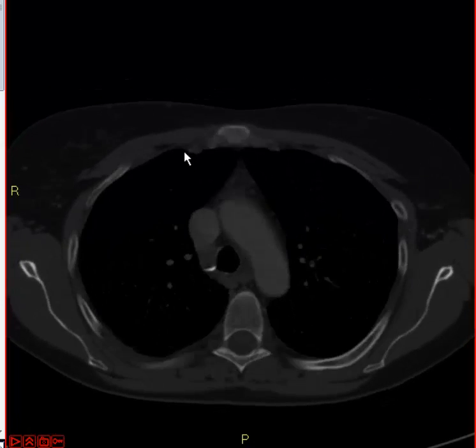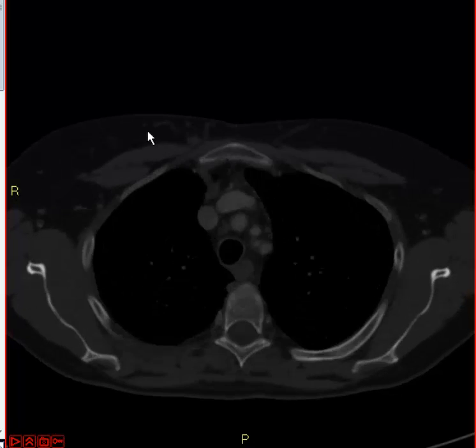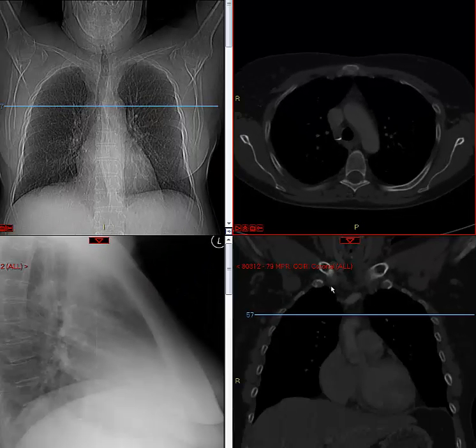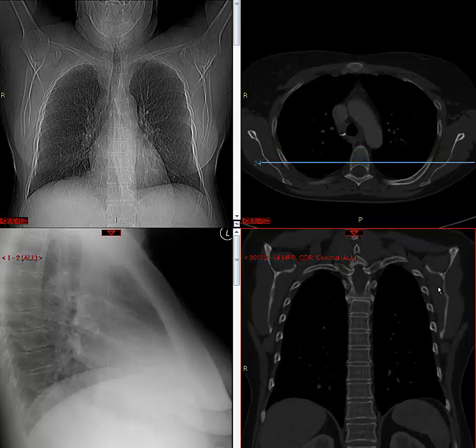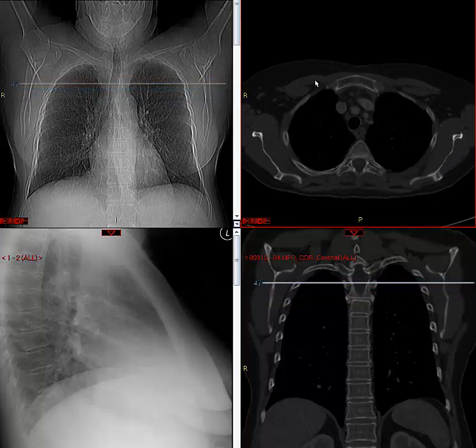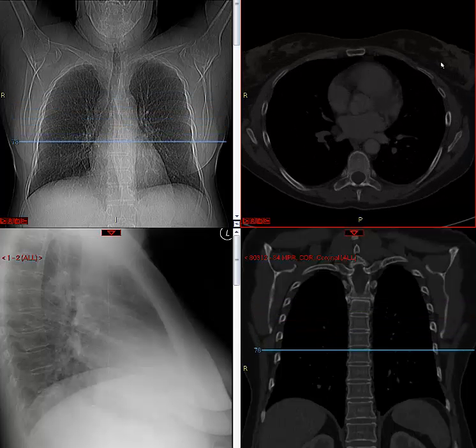Other parts of the chest wall, you can see pectoralis musculature here, major and then minor. And this is the scapula, so you see subscapularis here. If we look to a frontal view and get in the area of the scapula, subscapularis would be here, supraspinatus, infraspinatus, teres minor kind of hidden in here, some trapezius, and ventral or anterior from the pectoralis muscle. Then this person is a female, and so we can see the breasts here. You see the breast tissue in this area.